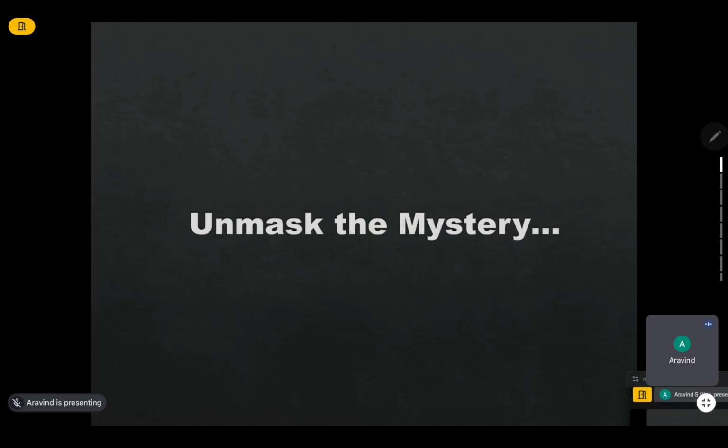So far we have discussed the systematic approach, in what way we have to observe the chest X-ray and how we can spot any abnormality, whether it is highly opaque or highly lucent. Now let us have a question and answer session. Let's show a few slides. You try to interpret.